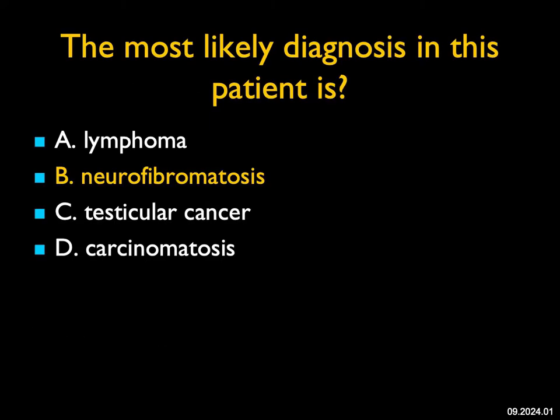This was a patient who has neurofibromatosis, and these are neurofibromas in the retroperitoneum, in the mesentery, in the paraortic region. Patients with neurofibromatosis can have really extensive neurofibromas and simulate malignancy. Of course, we need to be careful because neurofibromas can become malignant. Some patients with neurofibromatosis do have an increased incidence of that transition.